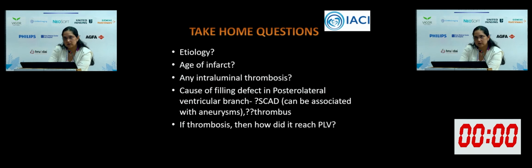And the age of the infarct: she complained of similar episodes in the past, but though we couldn't find any edema on STIR, this could have been of recent origin, as it matched the PLV territory, so I think it was of recent etiology. And any intraluminal thrombosis, this question could have been very well answered if we did a CT.